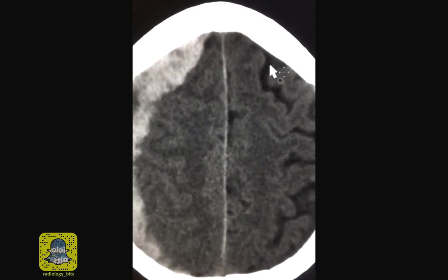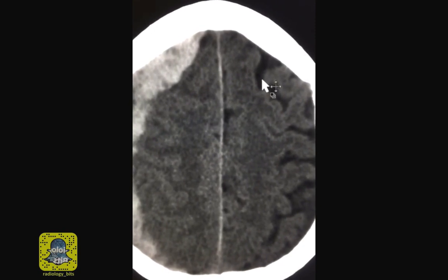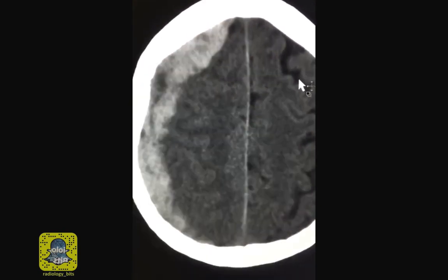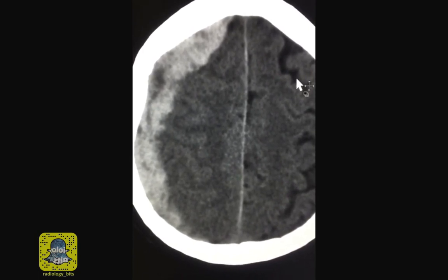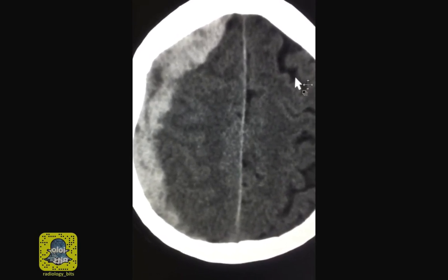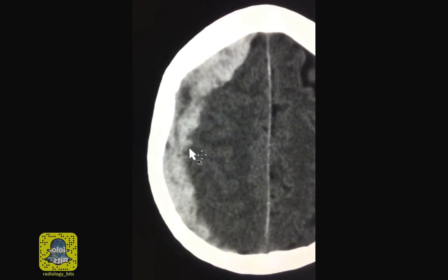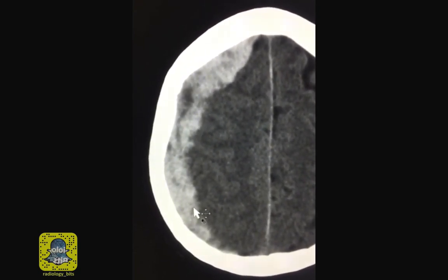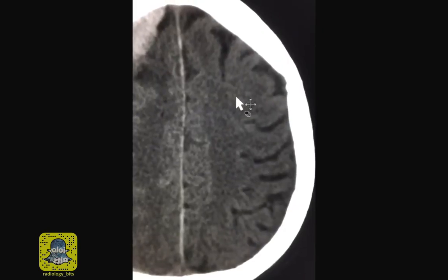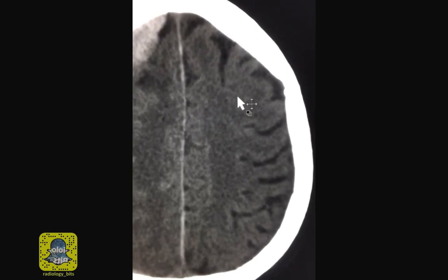Subarachnoid hemorrhage is hemorrhage that fills the subarachnoid CSF spaces such as the sulci, and here you don't see any blood filling those. However, the two types that are commonly confusing for beginners are the subdural versus the epidural hematoma. When you see an extraaxial acute hematoma such as this, you have to decide if you're looking at a subdural versus epidural one. To understand that, let's talk a bit of anatomy that we know from before but is difficult to see on imaging.